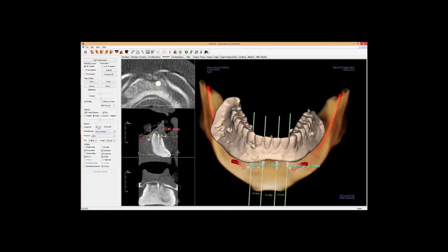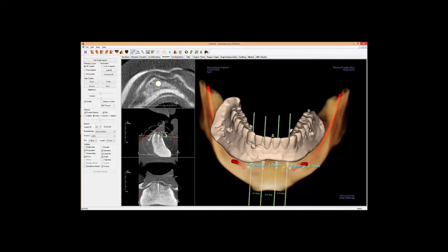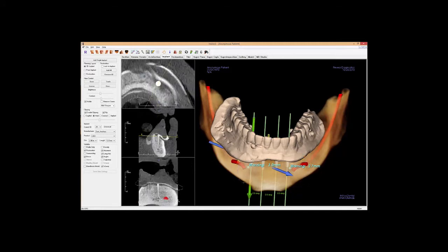So let's do that for 26. Let's check the space we have here on number 23. Good. And we'll go to number 21 here. Excellent. And finally to number 28. And looks like there's plenty of room here as well. Good. So everything looks nice.